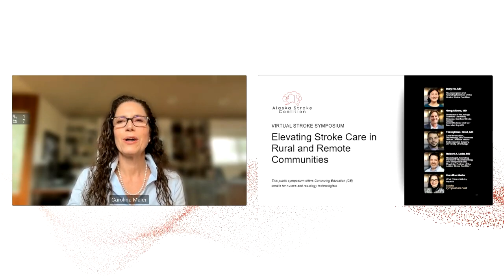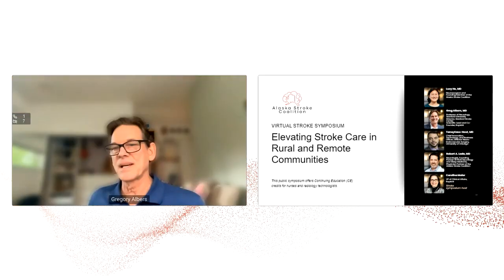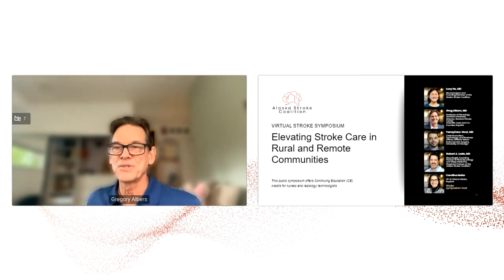One last point, yes, Carolina, is that oftentimes the community hospitals think, oh, I don't need perfusion, it's too advanced. But any scanner that can do a CTA can also do a CTP. So what we've found in Northern California is that even the small community hospitals that have adopted CTP have found it to be incredibly useful, oftentimes being able to avoid transferring patients who either don't have a stroke or have a stroke that can be managed locally.